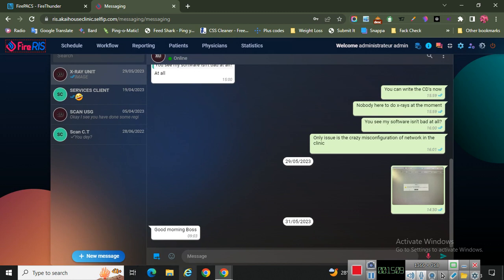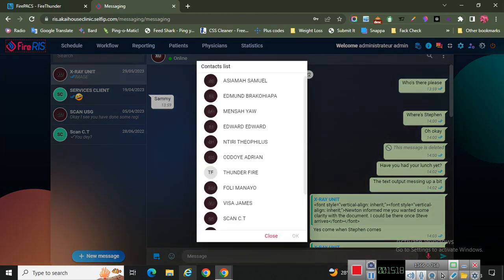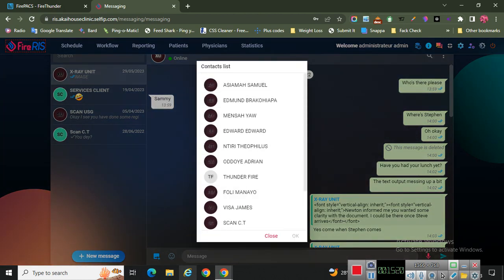Tell them the name, the message, what needs to be done, and they'll do it. If you want to tell admin anything, new message, look for admin. I'm signed in as admin, so you won't see it on the list.